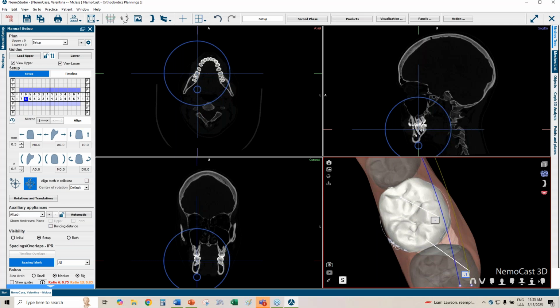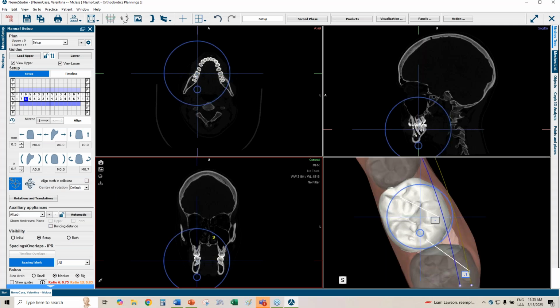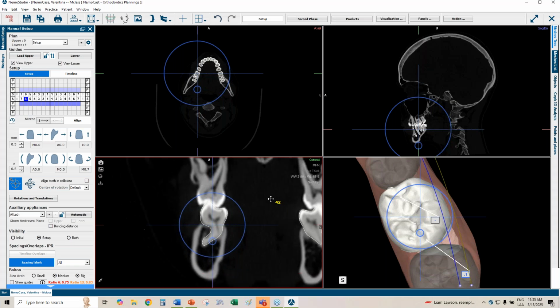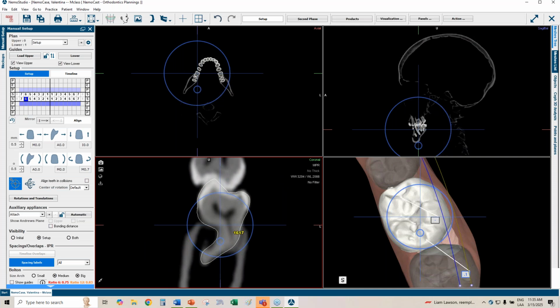So what I would do first is select a good rotation for this molar. In this particular case, it looks very good. Select the tooth, change the tracker. The 2D tracker is already activated down here. Let's see how much space I can visualize virtually right here for the lower arch expansion, mainly trying to reach towards zero.